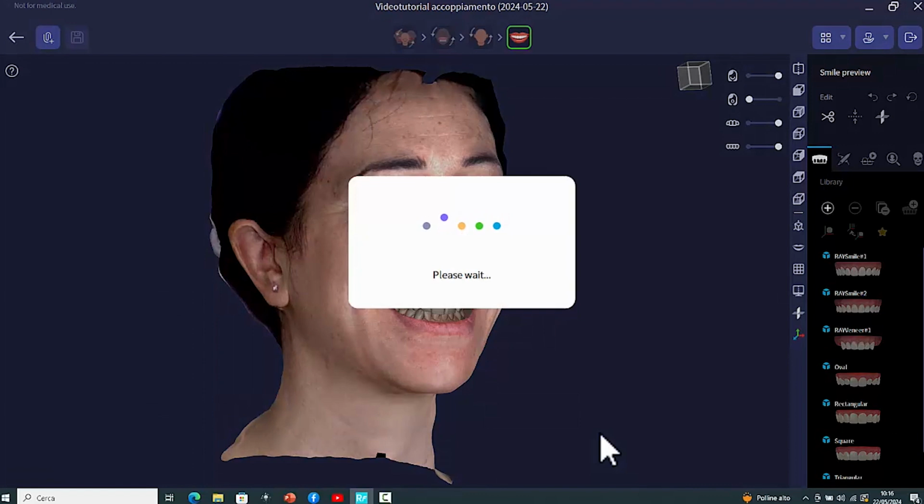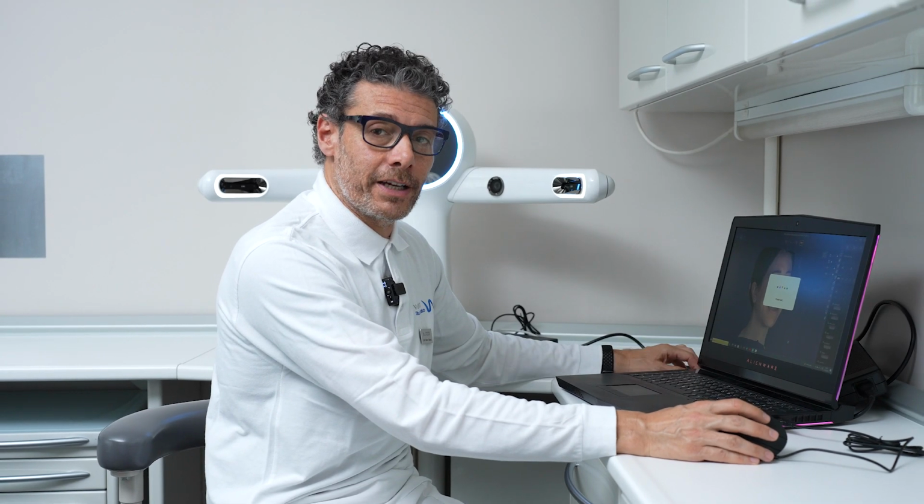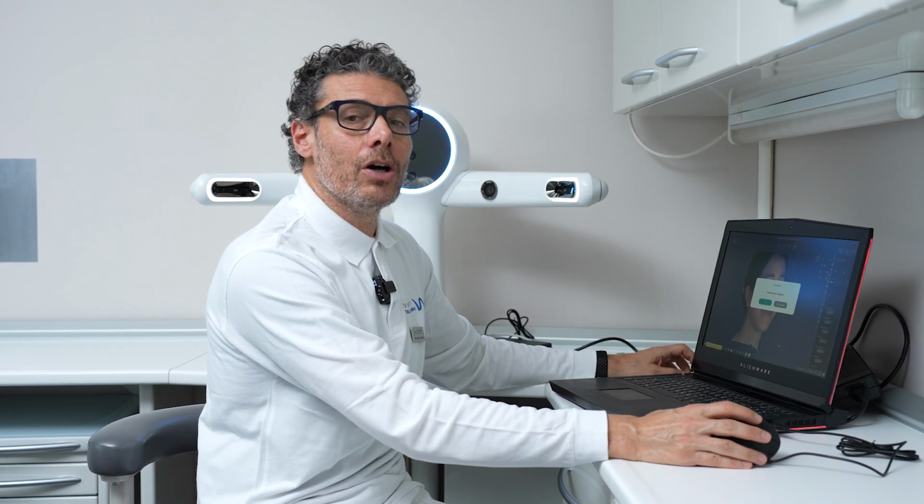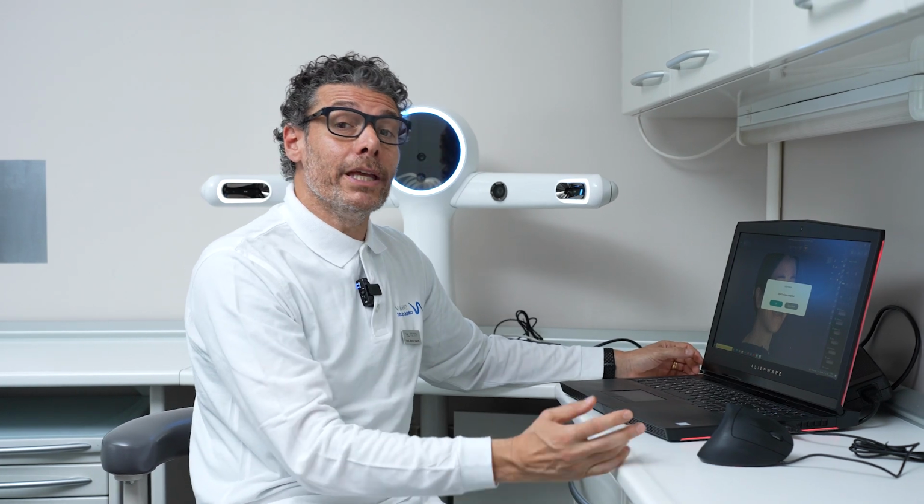Next, I will simply send this folder with all these files to the lab. And in the second part of the video, Laura will show you how these files are automatically aligned within the dental system.